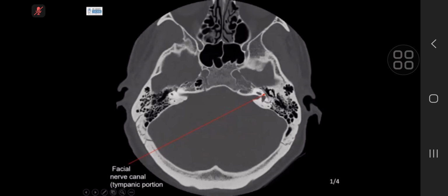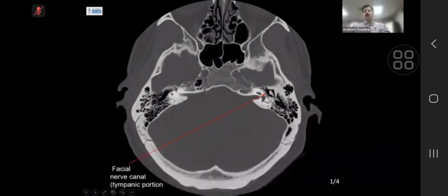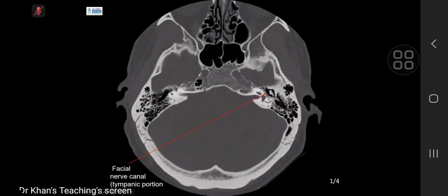Candidate one? Yes, if that's the tympanic part, so no. Is this one? So tympanic part is this one. There is something else which is just superior to this level. Of course, on an axial slice, you are seeing a bit of partial voluming here.